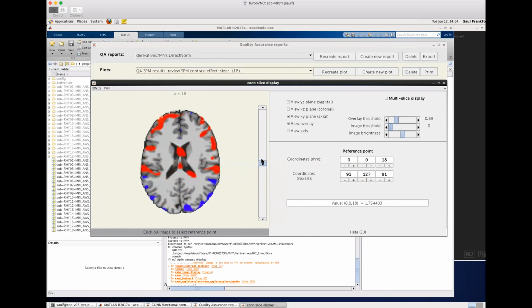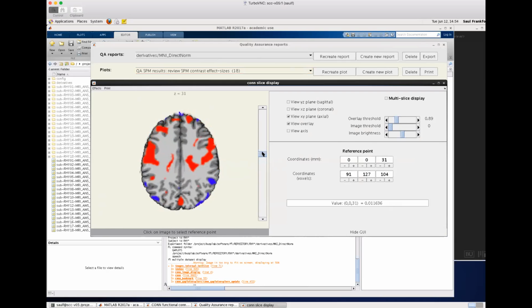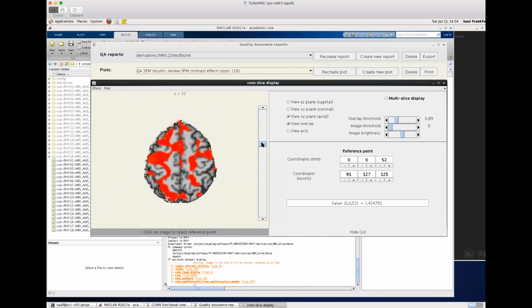No, sorry, you meant the right thing. That would be motion, right? So all of that ventricle stuff, and that border. There's still a lot of motion-related stuff, the same as in the previous subject. You stop right there.